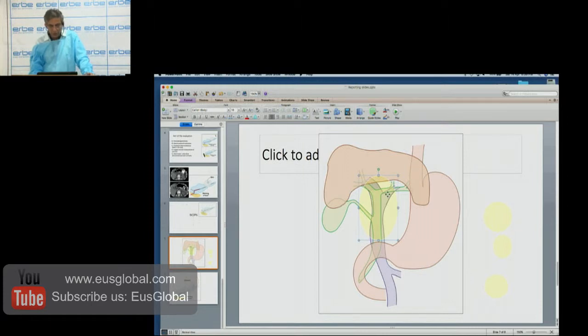This tumor we should preferably try to show in its relationship with the portal vein. Like I can say, today in the case that was done, there was mesenteric vein thrombosis, the one which ultimately proved to be a case of benign disease, and somewhere a tumor here in the pancreatic head and body of the pancreas, which was extending into the portal vein and into the superior mesenteric vein, but on which side, this side, this side, I can leave it here. Or whether I will copy it.